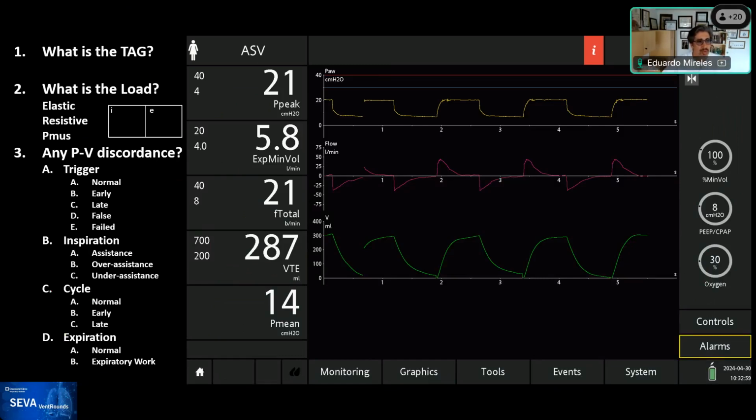So we start always with the tag and mode quality. In the chat, Samin put he was mid quality. I think he's high quality. But I would ask you, what is the tag for this mode? If you want to put it in the chat, you can test yourself on what you think is the tag. And I put the full screen. This is a screen capture. I know that Ariel is going to be proud of me for carrying the USB. Actually, Samin gave me the USB and I got the image from this. So anybody, what's the tag for this mode?